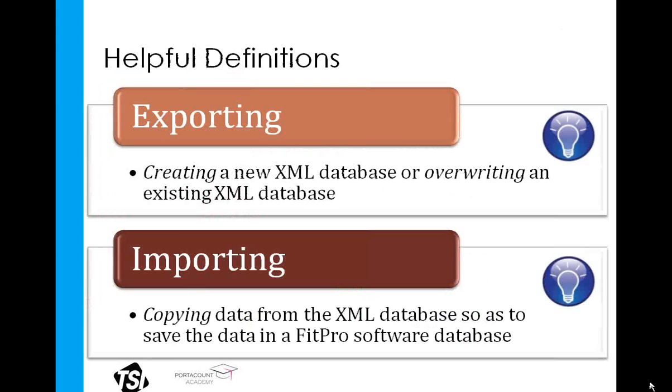Now, before we go much further, I just want to take a minute and discuss the two terms that you're going to likely hear a lot throughout this lecture. Exporting with the FitPro software can be defined as either creating a new XML database or overwriting a database that already exists. Again, these XML databases exist on the flash drive.